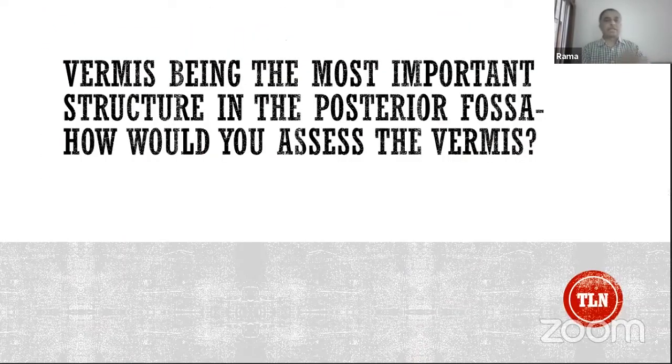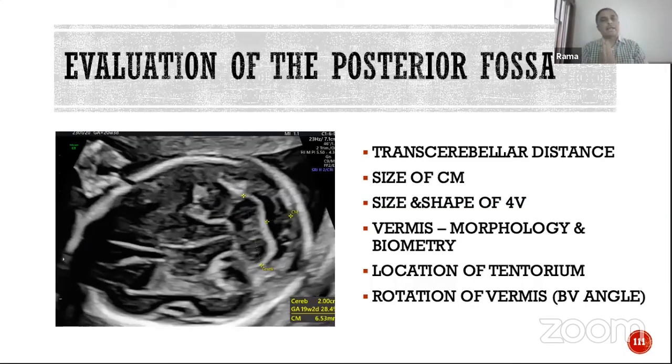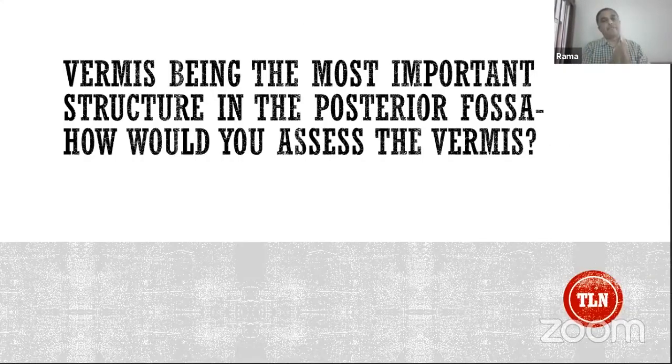Lastly, the coronal section will show you the same as what you see on an axial section. You see the intermediate echogenic vermis sandwiched with the dumbbell, the weights of the dumbbell on either side being the hemispheres. I think the three planes are important, but we do the second and the third plane only if we have a problem in plane one. And one of the problems that you've already started discussing is the open fourth ventricle.